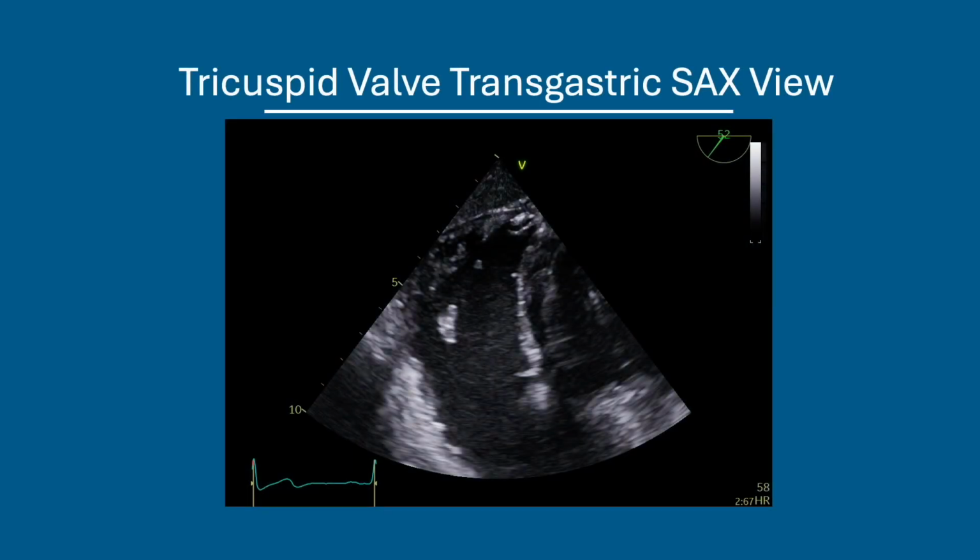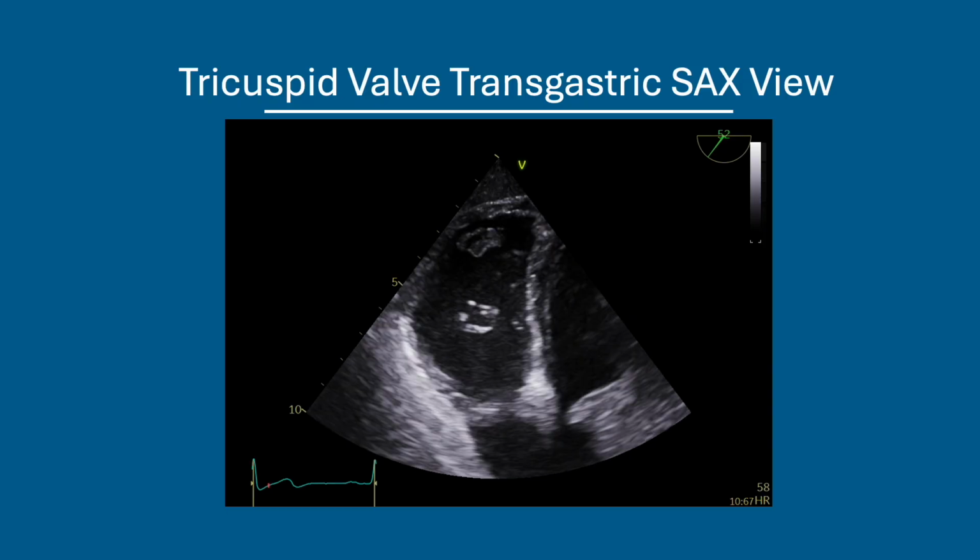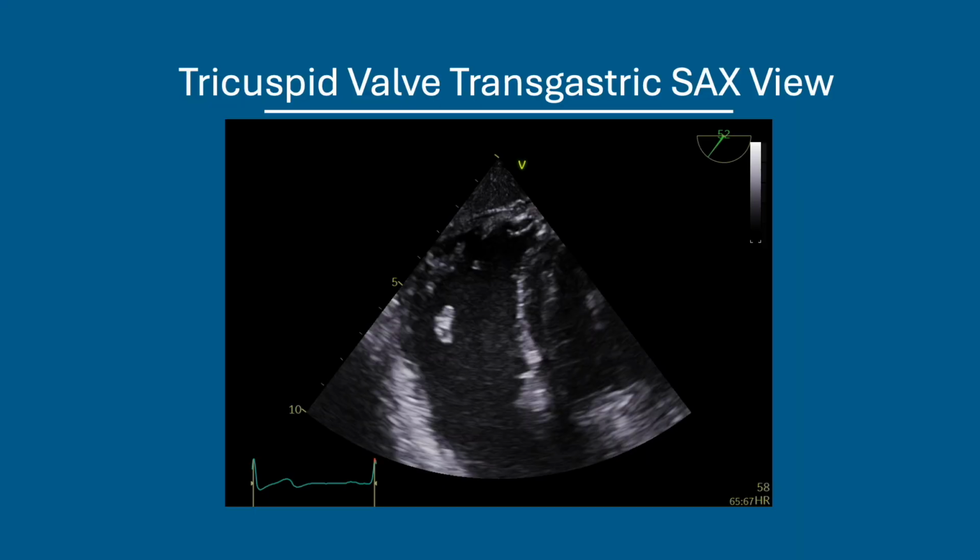Of the tricuspid valve pathology, you can use the short axis view to identify the number of tricuspid valve leaflets, the location of regurgitant jets, the number of regurgitant jets. You can also infer the size of the regurgitant jets, as well as get some sense of the mechanism of the regurgitation. Sometimes you'll see pacemaker wires or leads in relationship to the regurgitant jet and the leaflets, and that may help you begin to formulate a hypothesis as to the mechanism of the regurgitation.